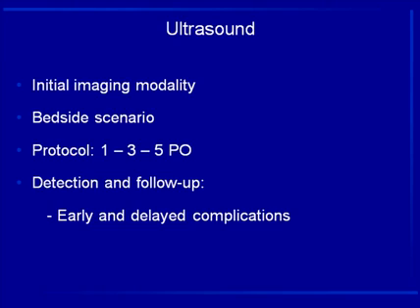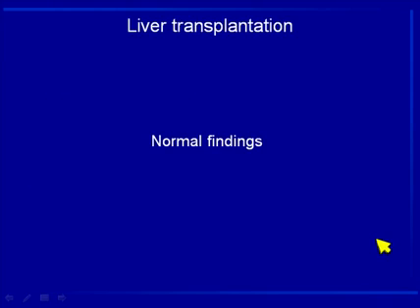Ultrasound is the initial imaging modality. It can be performed in a bedside scenario. In our hospital, we developed a protocol studying the patients in the 1st, 3rd, and 5th post-operative day of liver transplants. And with it, we can perform the detection and the follow-up of early and delayed complications.